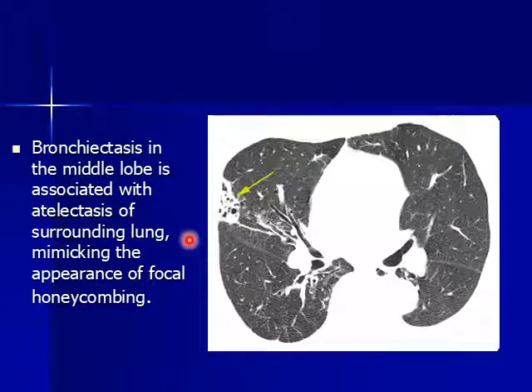But if we do MinIP, we can see that these are representative of either honeycombing or bronchiectasis or bronchiolectasis.